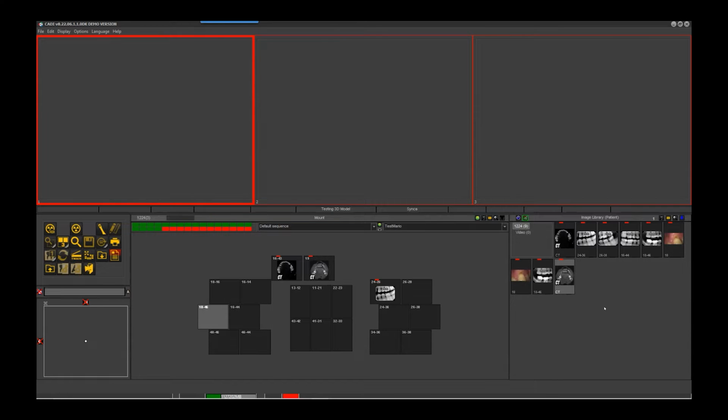Now, Open Dental does have the capability to create a two-way bridge to our software. Right now they created just a simple bridge, but we've given them all the documentation to create a two-way bridge, which basically would allow, when you take an X-ray or an image, anything, that image to then go into the patient chart of Open Dental.